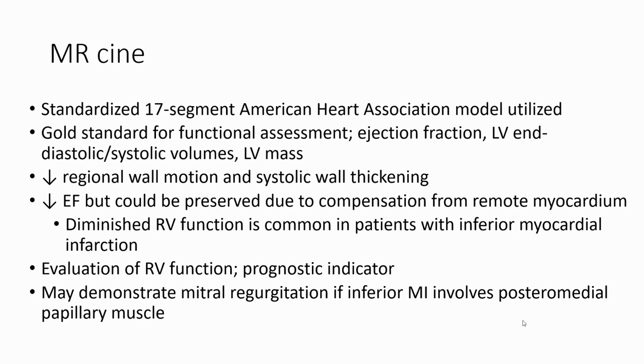Cine MRI signs: it is standardized with the 17 segment model. It is the gold standard for functional assessment: ejection fraction, left ventricle end-diastolic and end-systolic volume, and left ventricle mass.